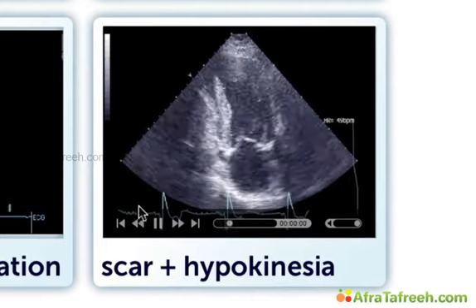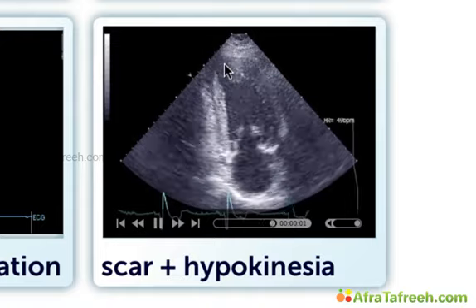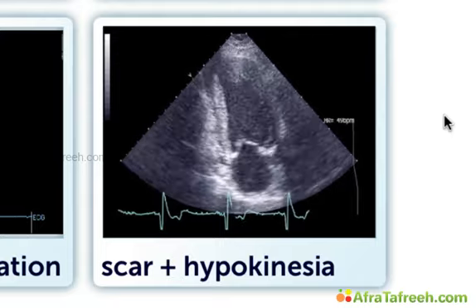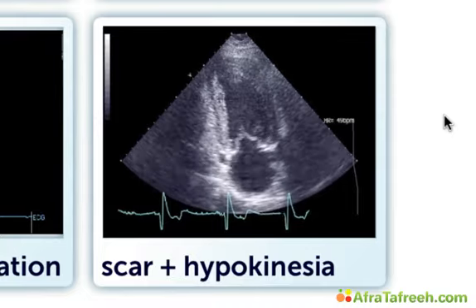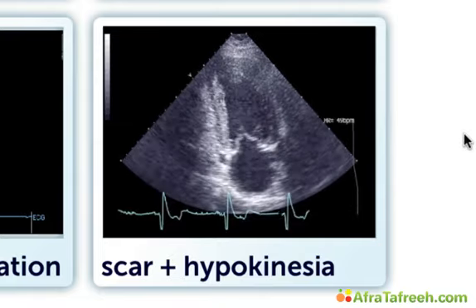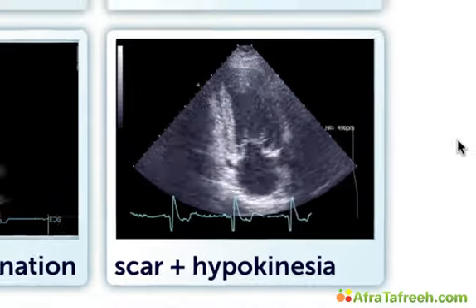And here we have an example of a patient who had an infarct 3 or 4 years ago, an anterior infarct, and the patient never had angiography at that time, but now he presented with typical anginal pain. We performed angiography and we found that the LAD was significantly stenosed, and since the patient had an echocardiogram with a preserved wall thickness and hypokinesia, we knew that it would make sense to really reopen or at least dilate or stent the vessel.